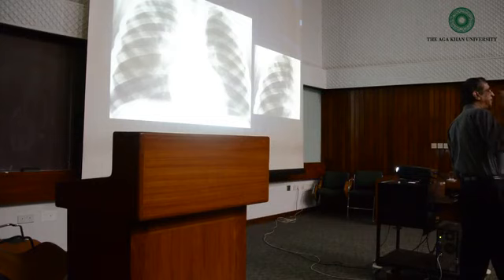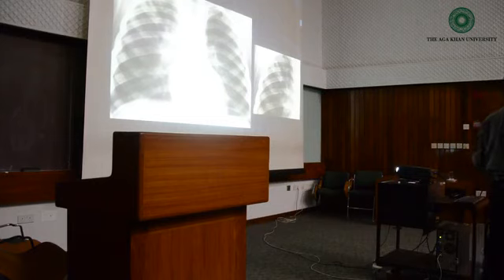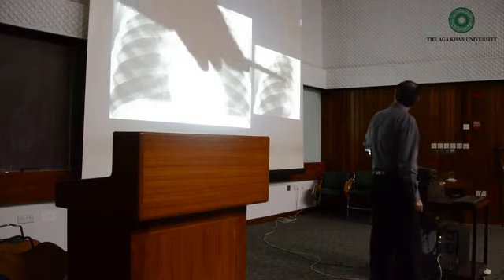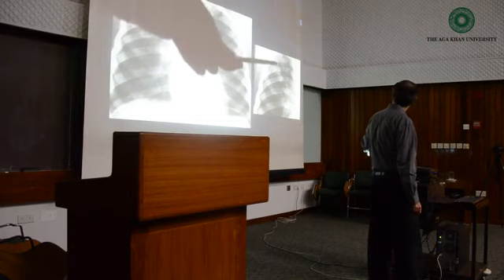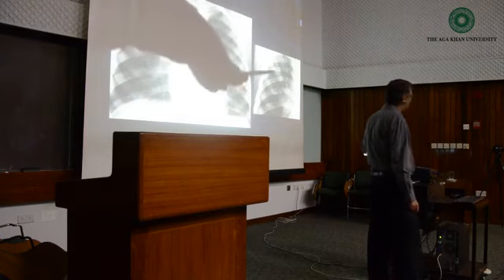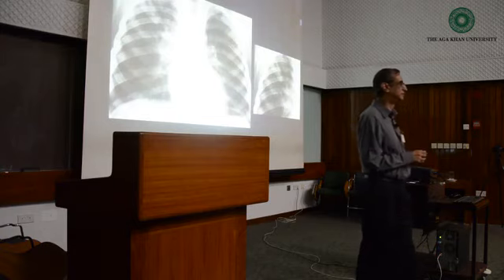Is it clear now, primary complex? This is the second example. That was on the left, this is on the right. And that is a close-up view. So you can also see it shows better. Focus and enlarged lymph node, and put together it's a complex.